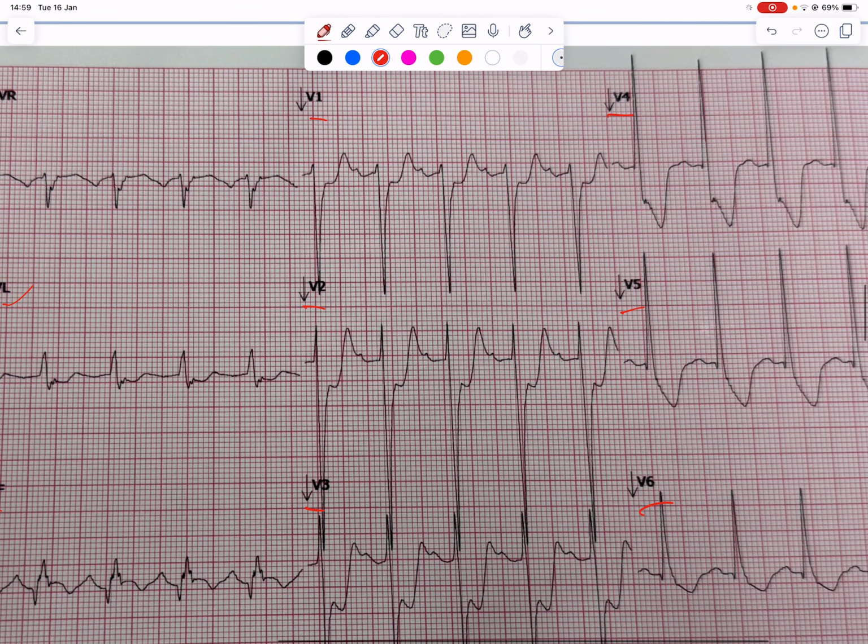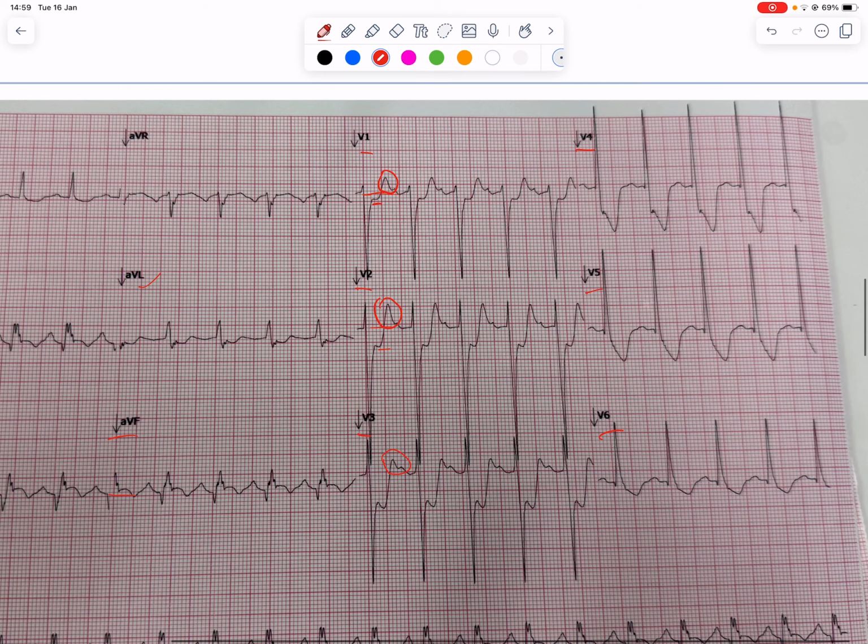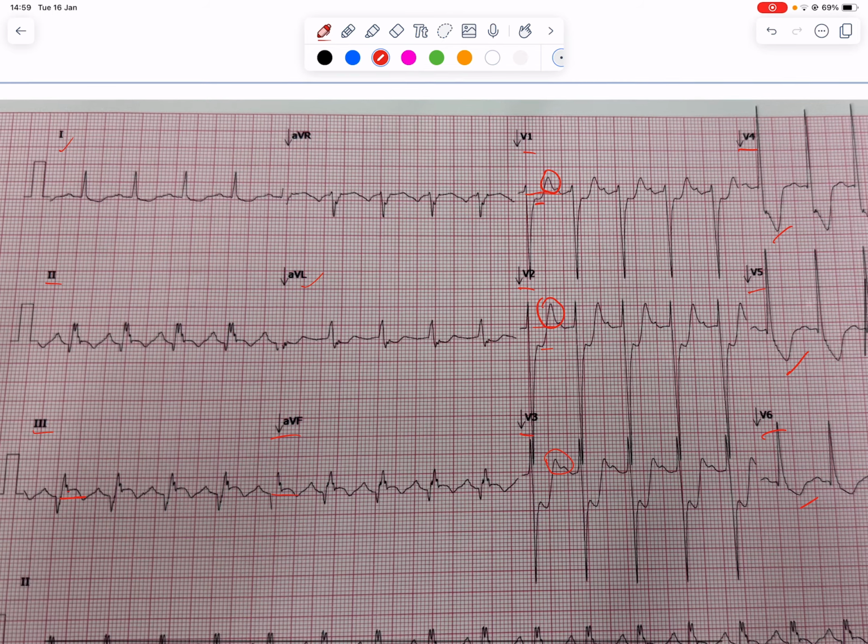On our septal leads, something interesting is happening, which I will discuss a bit later, but that's your isoelectric line. We can see that there is ST depression, right, in your V1 and V2 across through to V6. Interestingly, though, it's horizontal ST depression in V1 and V2, and you've got upright T waves, right? So just bear that in mind, that you've got upright T waves in V1, V2, V3, whereas in V4 through to V6, you've got these inverted T waves, right?